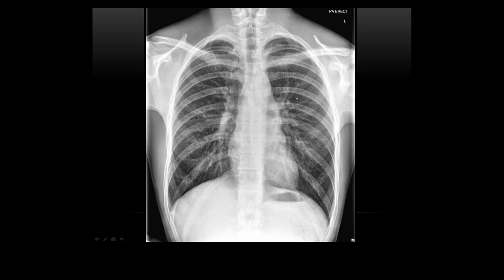So what they do is, when they say measure from the hilum, I always choose the hilum angle to go from. So I look for my hilum angle, which is here. I can see that triangle there, so I know it's there. Then I work my way out to the edge, and you want to follow the pleural line. It's such a small one, it's difficult to see, but you'd see this pleural line extending all the way down.